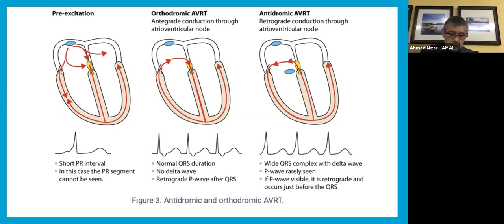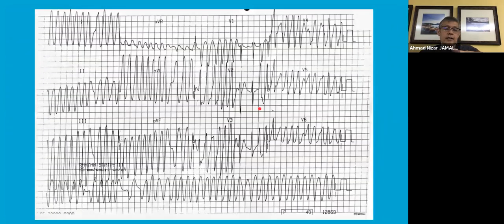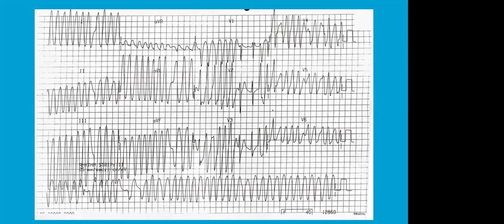If you go to the last ECG, this is an example of a pre-excited atrial fibrillation. So how can you tell? If you look closely in certain leads, particularly, let's say, in V4, you will see delta waves in the upstroke of the QRS complexes. The other hallmark is these patients can usually be quite stable. They'll be talking to you. They complain of palpitation. And you look at the RR interval, it's irregular. But this is not VF. It looks like VF, but it's not VF. It may confuse you with polymorphic VT as well. This is pre-excited AF, yes.